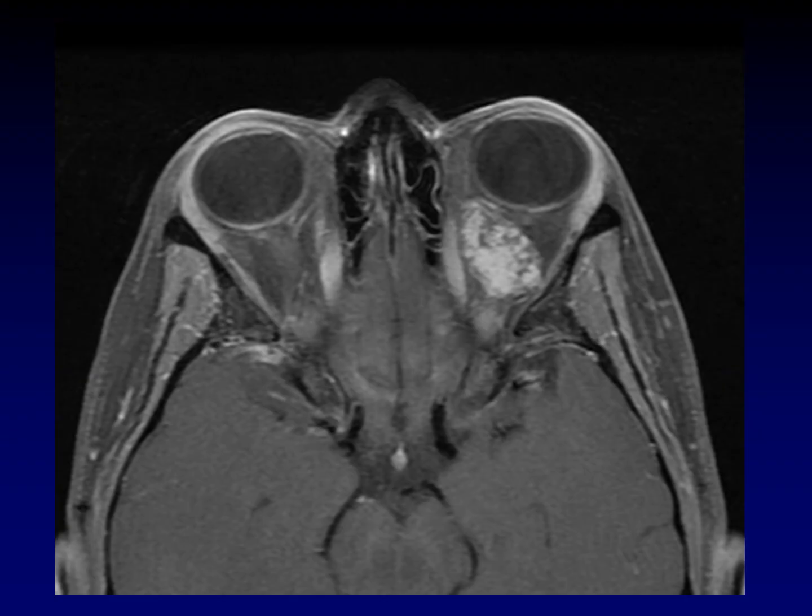When you see a lobular enhancing mass within the orbit causing relatively little mass effect, that's when you should think about venous malformations, hemangiomas. Notice how lobular the enhancement is here. These are slow to fill with contrast, and so if you do sequential images on CT, you may be able to watch it fill in just like we do in the liver. Notice that although this is a fairly large mass, there's really no exophthalmos, another clue that we're dealing with a hemangioma. The lobular configuration, though, I think is the biggest clue.